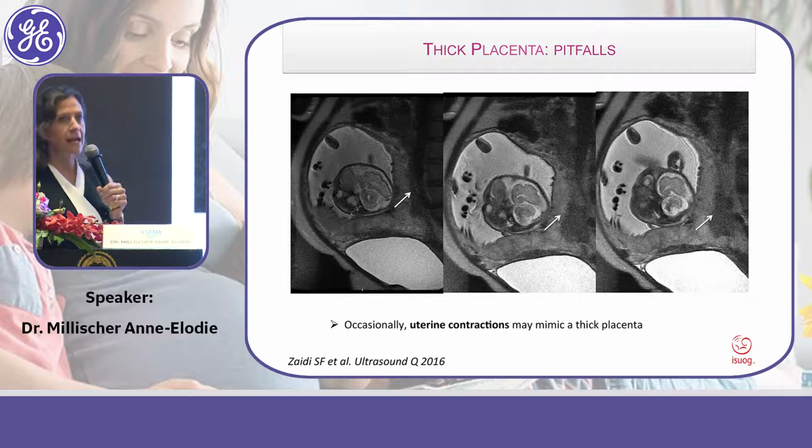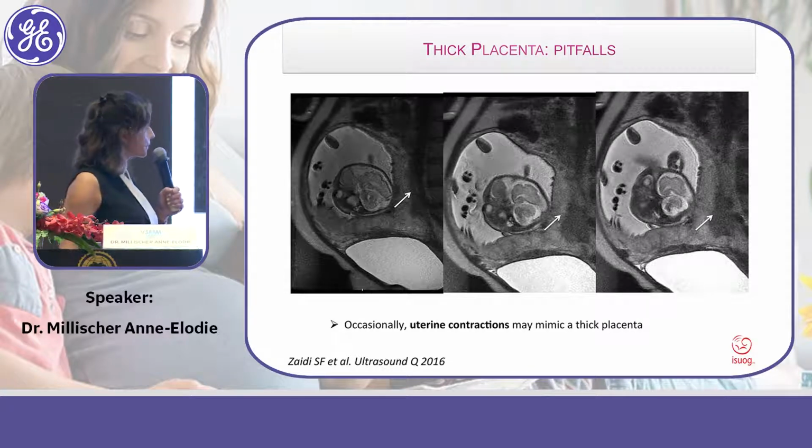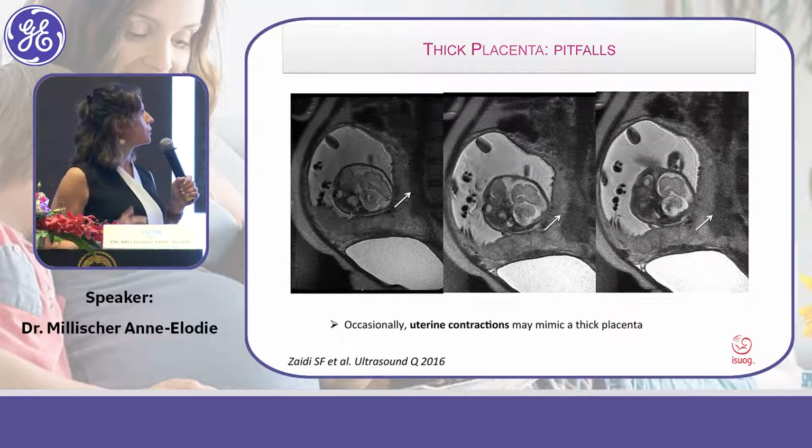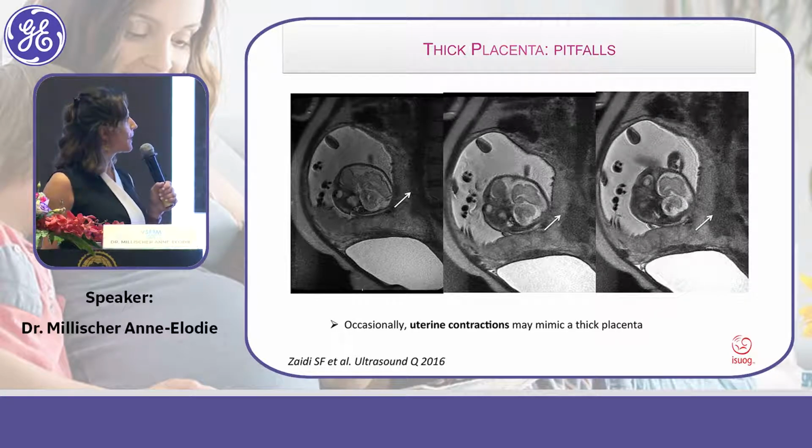With MRI, sometimes we can misdiagnose the fake thick placenta, which is just due to a contraction, as you can see on this picture.